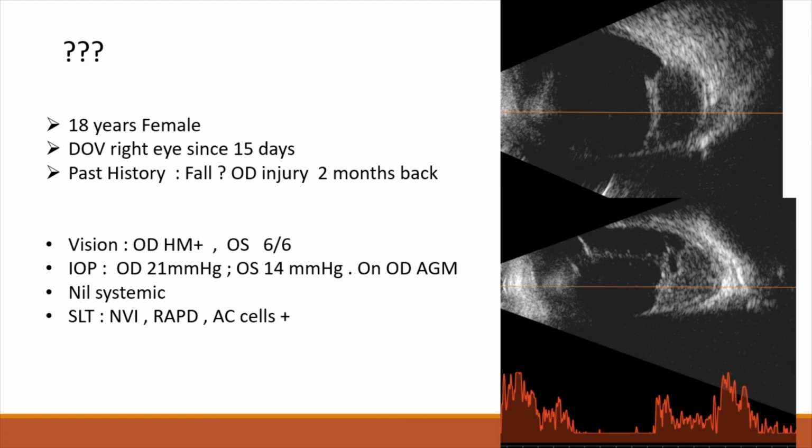The ultrasound B scan with A scan graph shows low reflective dot echoes in the vitreous cavity and one hyper-reflective membranous echo with a high spike suggestive of localized retinal detachment, with subretinal high reflective dot echoes suggestive of subretinal hemorrhage, and choroidal thickness looks within normal limits.